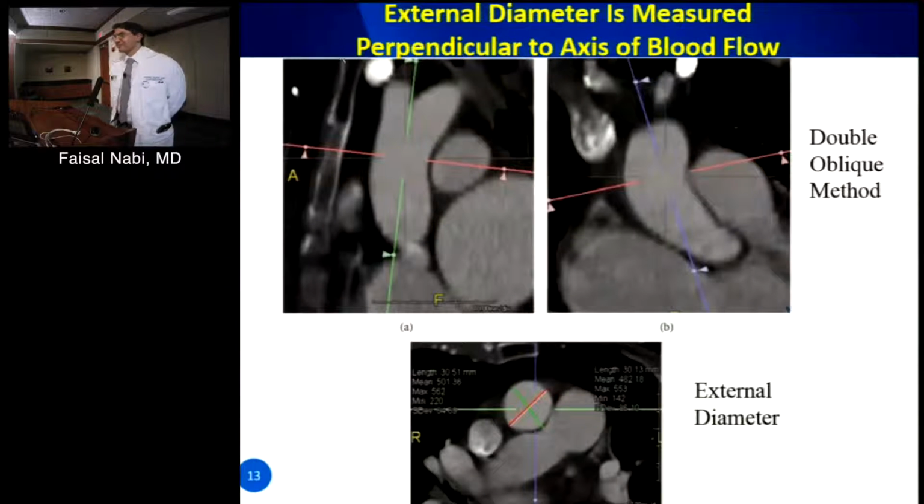Most cases were right on with the surgeon's measurement. Now that was before we had the newer methods. Part of the reason for that is radiologists just report axial dimensions. They don't reconstruct the aorta and turn it into a cross-section. And the one thing you find is, don't do that. If you just report axial dimensions, you may overestimate the size of the aorta. And I'll show you an example of that.